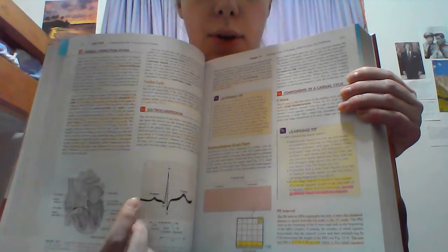and that's going to be important to know for the different measurements of intervals. It took me a long time last semester or PN year to actually understand that that's the box that we were looking for, so just wanted to clear that up if anyone had that problem that I had. And also this chart here, if you have your PN book, that would be good to look at as well.